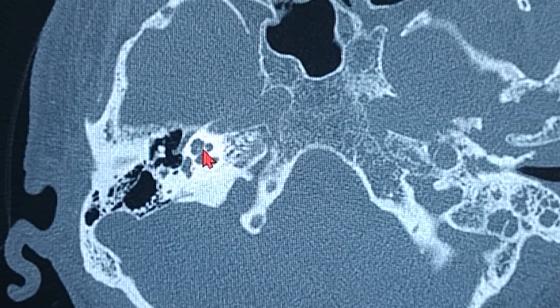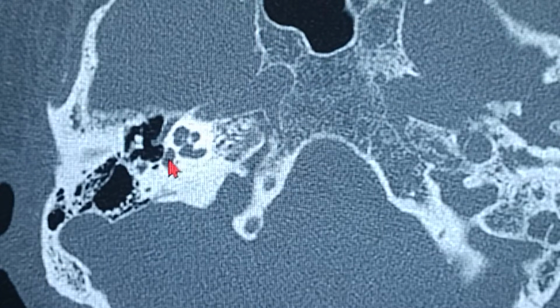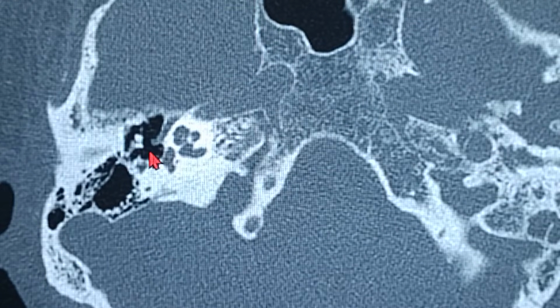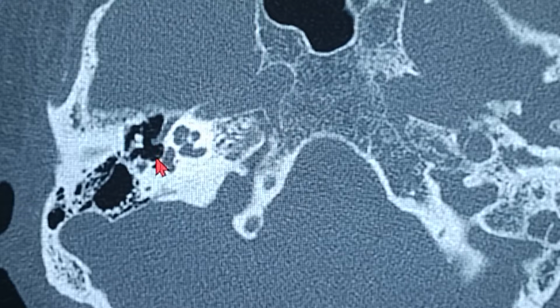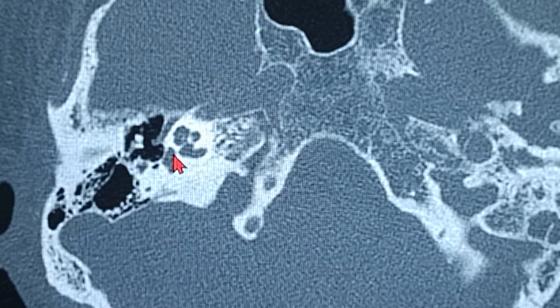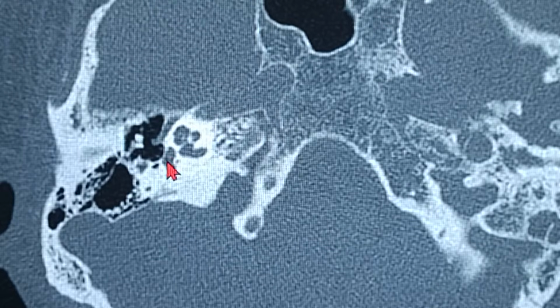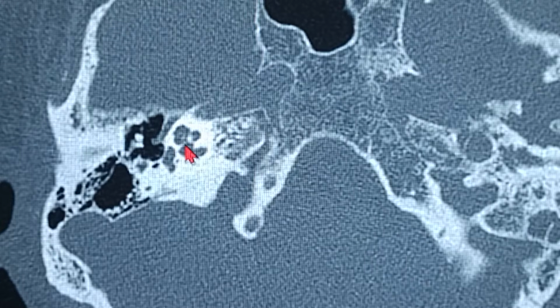And this structure now, which you can see, I'm just going to zoom this for you guys. This is the vestibule over here, which will correspond to the area of the oval window, and that's the ossicular. And sometimes you're going to see the stapes over here, but that later on I'll cover in detail after some time. So this is the vestibule area, remember this for now, that's the vestibule. And this entire thing is the cochlear apparatus.